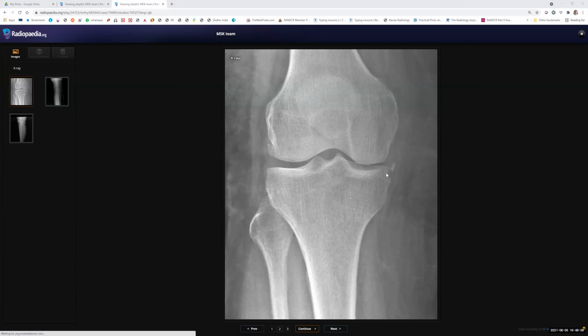There is an avulsed bone flake noted adjacent to the medial tibial condyle. You should not stop there. You have to say it's a reverse Segond fracture, and it suggests disruption of the medial collateral ligament. In addition, I am suspecting injury to the medial meniscus and PCL, as it's usually associated with PCL and medial meniscal injury. So I need an MRI. You have to validate why you are asking for an MRI, and refer them to the orthopedicians.